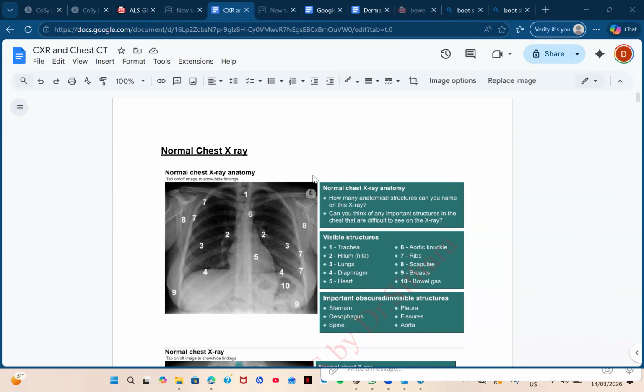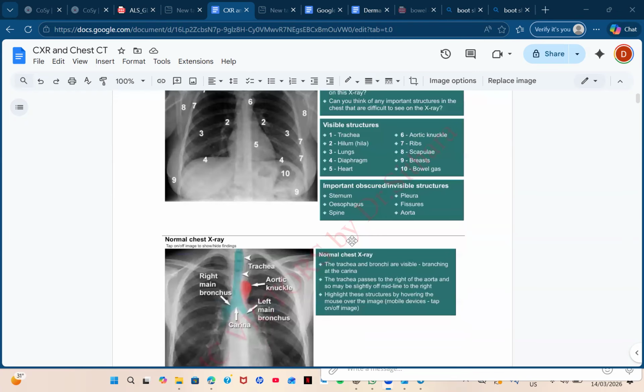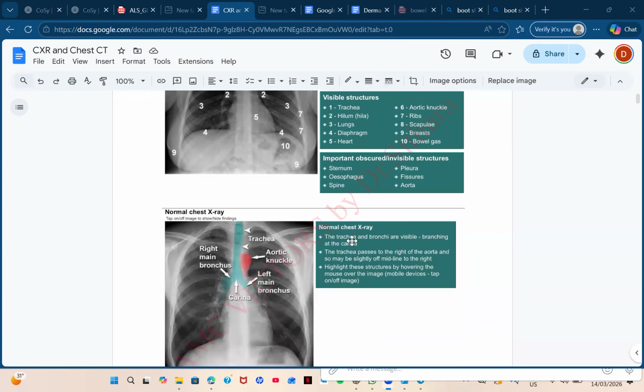We'll move on. These are the main points that you should know, and other than that you should know the treatment of each case, especially hemothorax. Please, in every month we have discussed, I think 5 months of recalls back, in each month they have asked about hemothorax.